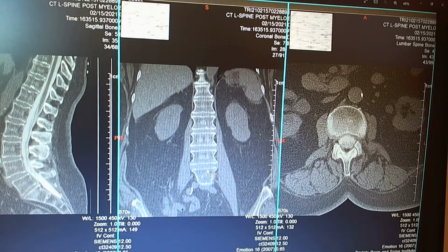What do you think, guys? Same density under the skin. Well, it is peritoneal space, but what is the structure in the peritoneum? Look at that, the density. What is the material? What is the tissue that is here? By the way, we have it right under the skin as well.